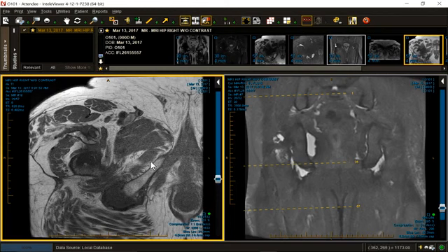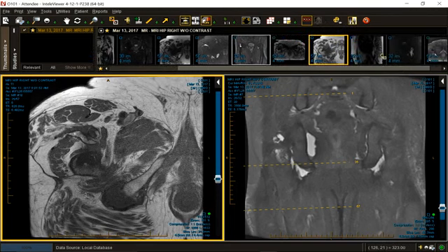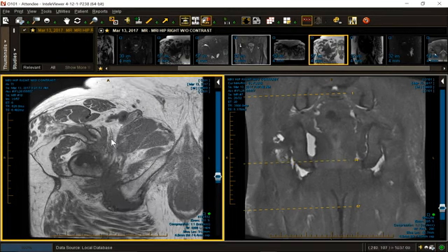The patient has another big problem, a common problem. It's right here. And what is that problem? Heterotopic bone. A lot of heterotopic bone. Medullary bone, cortical bone, there's a piece, there's another piece. It's everywhere.